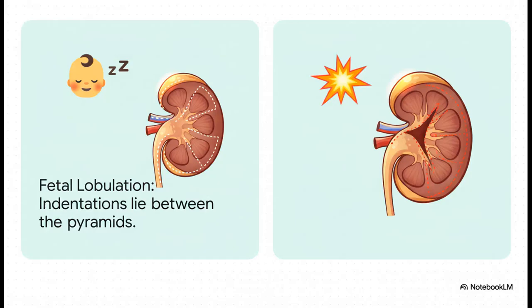Oh, this next one is a huge source of confusion. So sometimes the bumpy shape of a baby's kidneys just sticks around into adulthood.